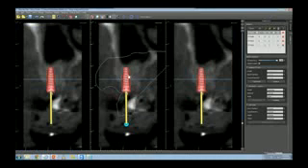So now I was able to take the implant. Here's the bone. There was a sinus graft done. And I'm able to line it up in the bone and in the central fossa of that crown, of that temporary crown.